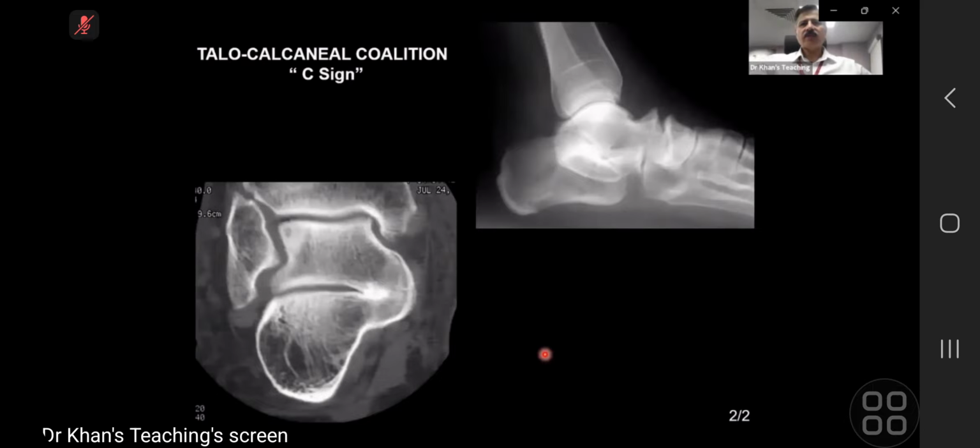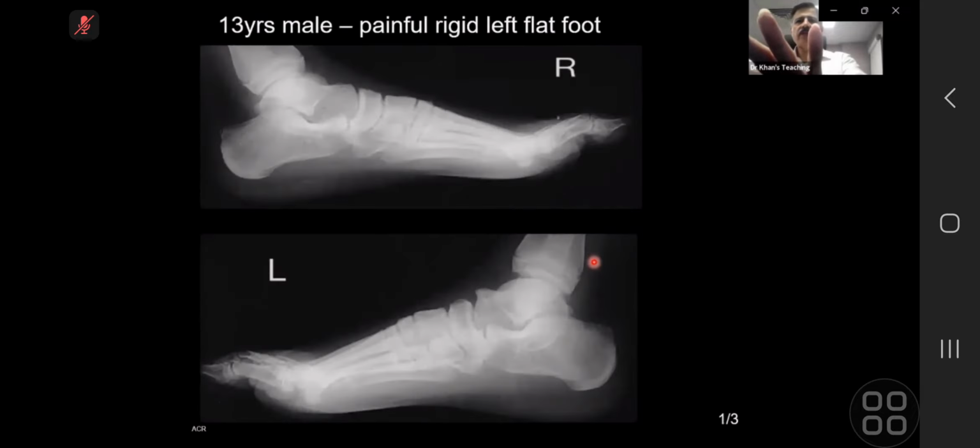So what happens is, if you go back just to refresh your anatomy, go to lateral, this is how it projects, right? This thing becomes very, very dense and prominent. This is a normal type of appearance, but then it becomes abnormally dense and very well defined.